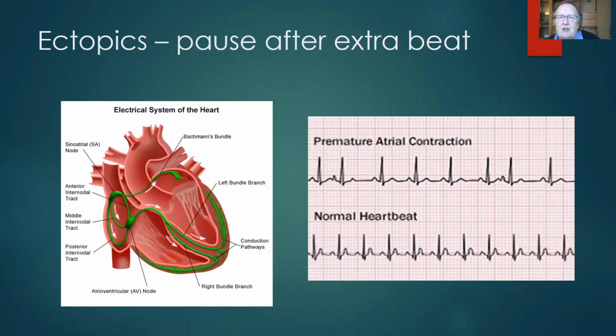Premature atrial contractions. This can come from too much stress or drinking too much coffee or naturally occurring phenomena. So let's look at this using our 11-point plan. What is the rhythm? Well, we can see that it is slightly irregular. What is the rate? Well, it looks normal rates for me. Are there P waves present? Yes, they are. Are all the P waves the same? No, they're not. We can see there the second impulse on the premature atrial contraction is a funny shaped P wave.